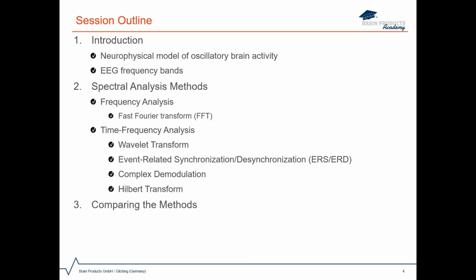In the third session of the webinar, the analysis results of the methods will be compared. Here, the characteristics of each method will be summarized, so you will have a full view on the differences and similarities between the methods. After that, options that are available in Analyzer 2 to export the analysis output will be provided.